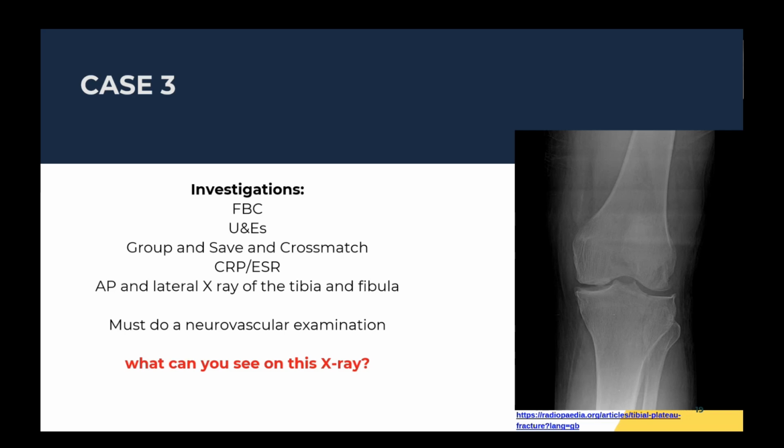So this is the X-ray that was taken. What can you see on this X-ray, if anyone can see any pathology? Can everyone see the X-ray?